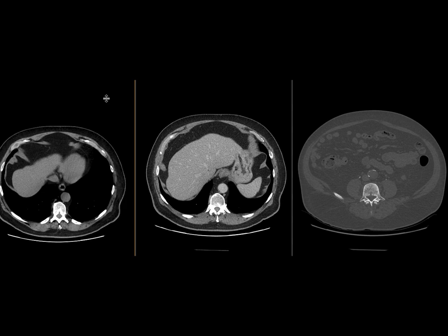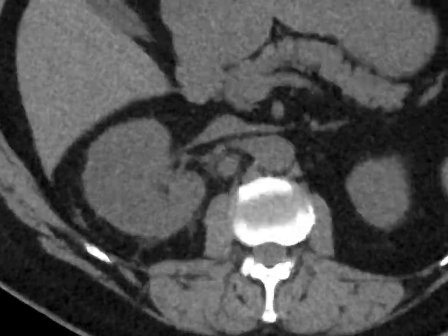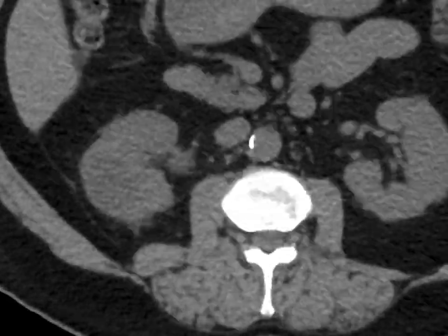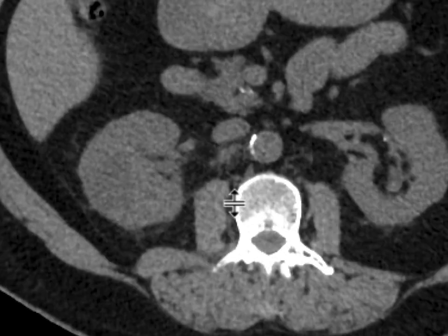This is a patient who comes in with hematuria. We do a regular CT hematuria protocol. We look at our non-contrast images. You can already start to see that the right kidney looks very, very abnormal. There's really loss of that renal sinus fat, particularly in the upper to mid-pole regions.